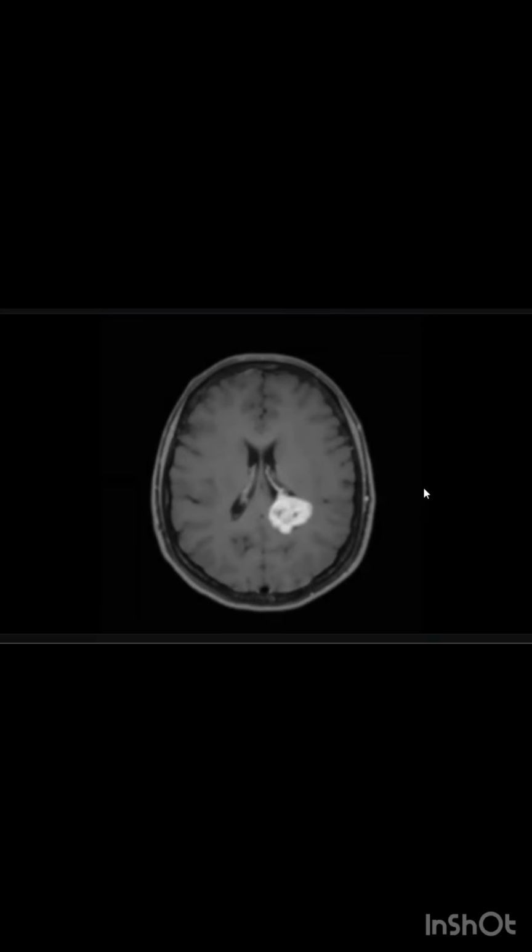What other differential for intraventricular lesion do you know? Maybe meningioma as well, which may arise intraventricular. I might put this as a differential because it was low signal in T2 and is avidly enhancing. Can I check the diffusion as well to see if there is diffusion restriction? No diffusion restriction. Okay, give me your final diagnosis and your management.